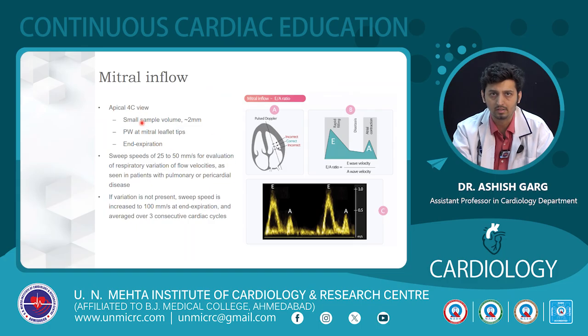We keep the sample volume at the mitral leaflet tips and a sweep speed of 50 millimeters per second for evaluation of respiratory variation of flow velocities. So as we can see in this diagram, you keep the sample volume at the mitral valve leaflet tips, and this is the E wave and the A wave that you get. And this pattern is suggestive of a normal filling where the E wave is more than the A wave in amplitude.